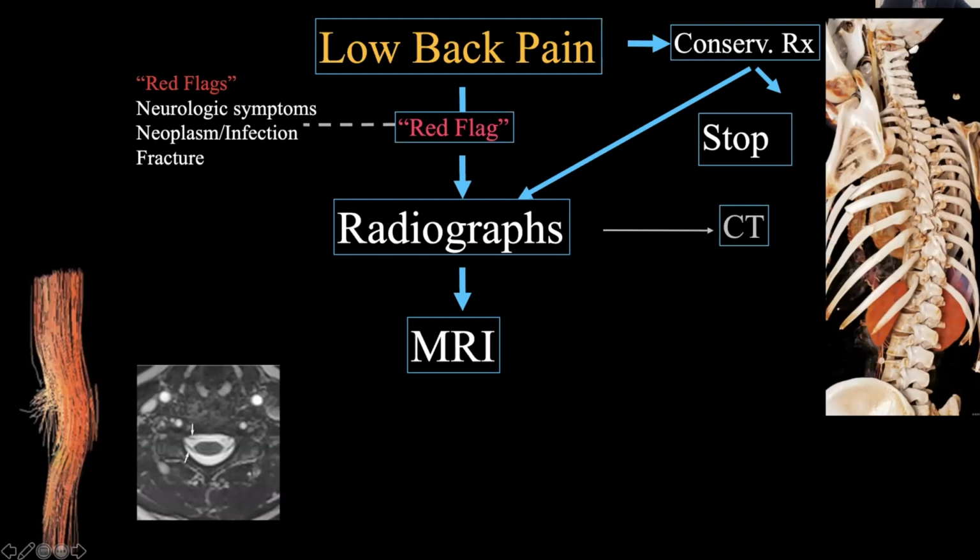And actually, this isn't your typical 3D reconstruction. This is what we call cinematic rendering. It's a new technology we have that actually allows us to depict our CT or MRI data in a photorealistic format. And I'm going to actually be using this quite heavily later on in the talk when it comes to looking at the anatomy, because this really allows us to see some of the anatomic details better than we would see on traditional radiographic evaluation. So look out for that. That isn't available everywhere, but that is something that I think will become more and more a part and parcel of everyday practice.